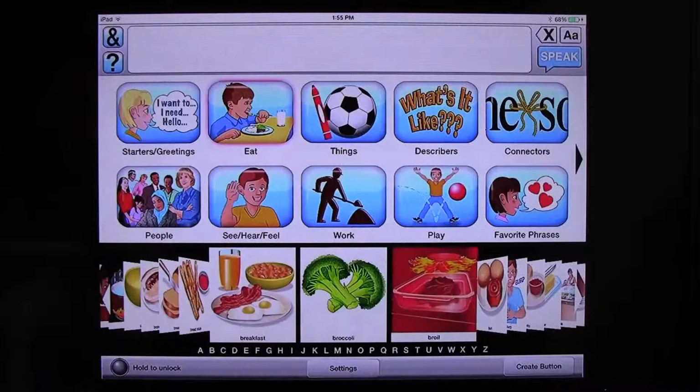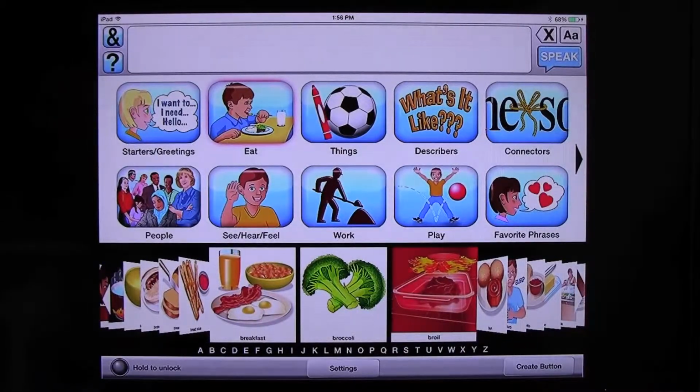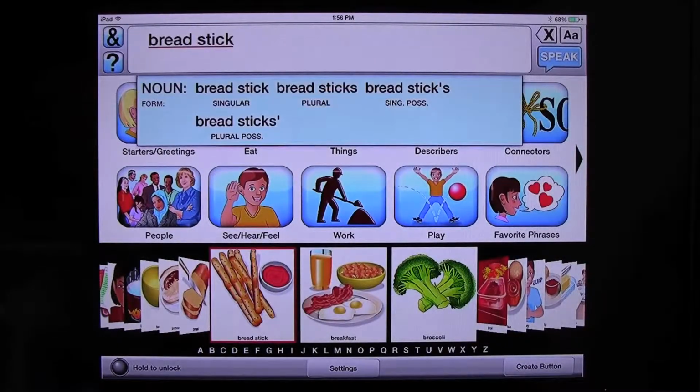But anyway, the neat thing about how we display the items within each category is our own custom version of what Apple would call the cover flow. You may be familiar with this from iTunes or your iPod or something like that. What we've done is we've put three open face tiles in the center, and either of these is selectable.